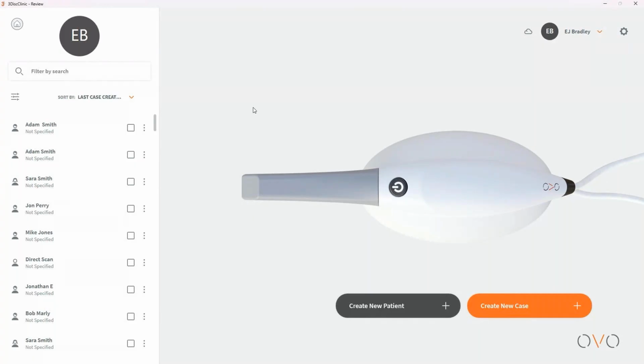We're going to go ahead and focus on our settings today. In order to do this, we're going to take our cursor over to the upper right-hand corner and select the settings wheel here. You're going to see that some of the settings can be altered down here at the bottom based on the offerings here within our settings.